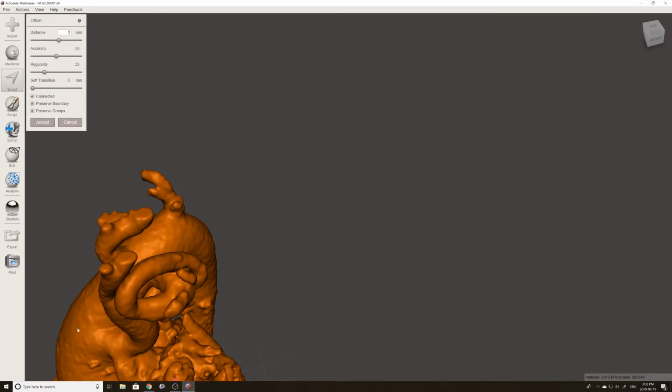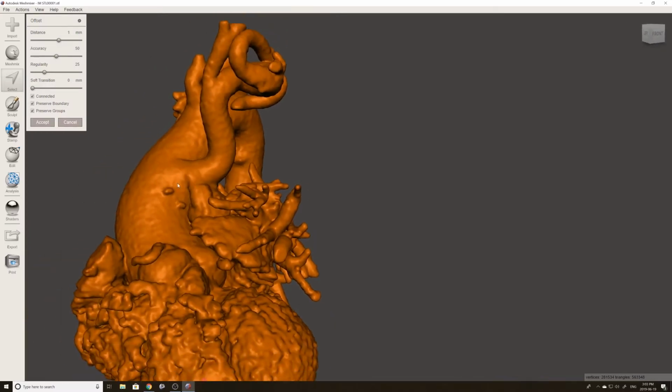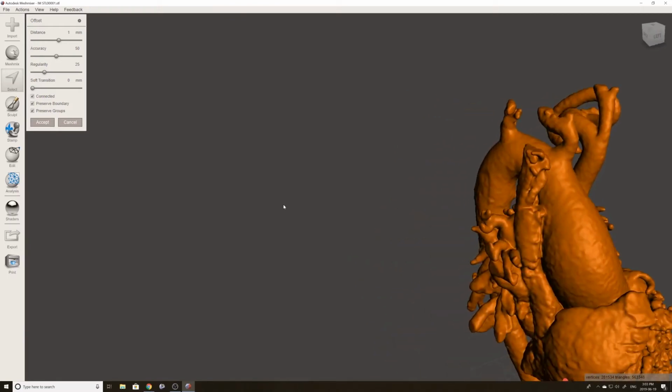Again, that was at 0.5. Now I'm going to show you what it's like if we offset it by 1 millimeter.